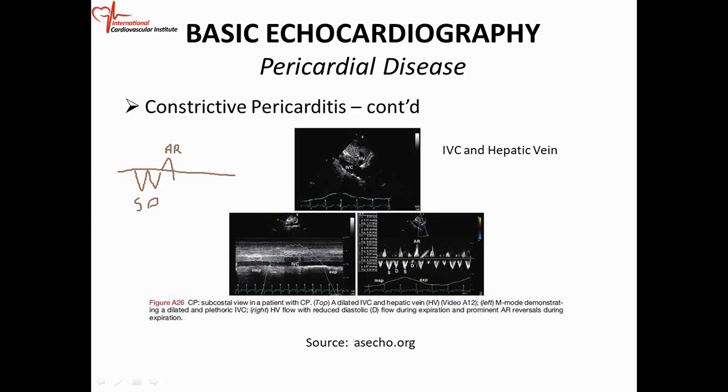Well, septal bounce is very important. Septal bounce is very important. Okay, so with inspiration, the septum moves to the left. With expiration, it moves to the right. Okay. When you look at your tissue Doppler imaging, the patient is in heart failure and you think it might be a muscle disease, your E prime is going to be large.